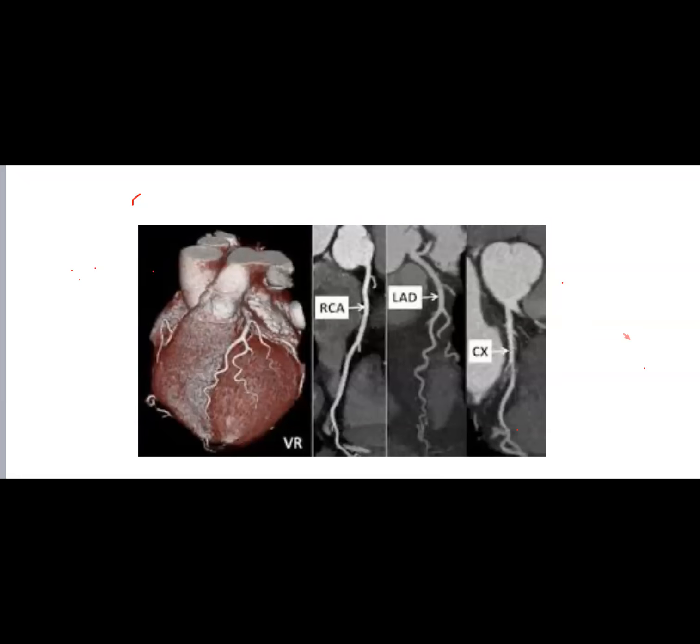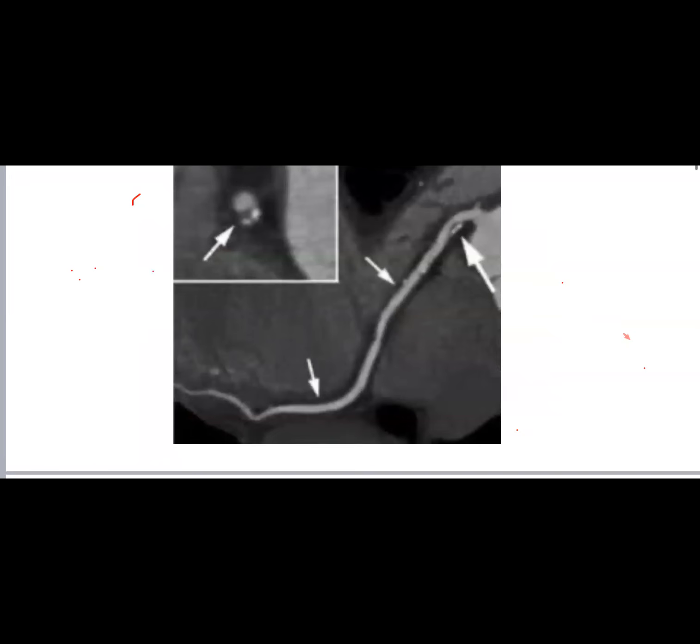It shows the artery in different formats, one of which is called multiplanar reconstruction, the one on the right, which is great. You can study and analyze the vessel across its entirety for any atheroma like this one here. You can see I have mixed plaque, calcified and non-calcified plaque. And if you do coronary angio for this patient, you might not appreciate any significant stenosis. But cardiac CT can pick up the plaque.